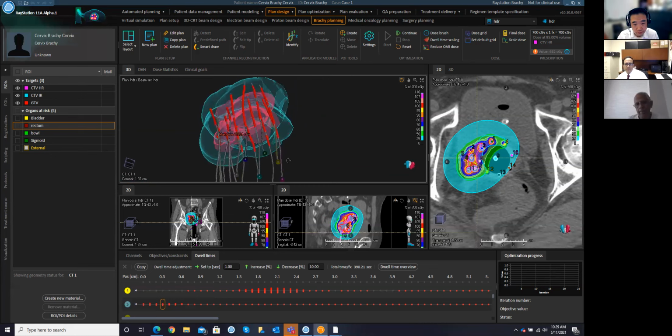So if you have an endobronchial and you have it find the applicator, does it think it's going in from the bottom? I really have no experience with that. Does anyone else from the team?